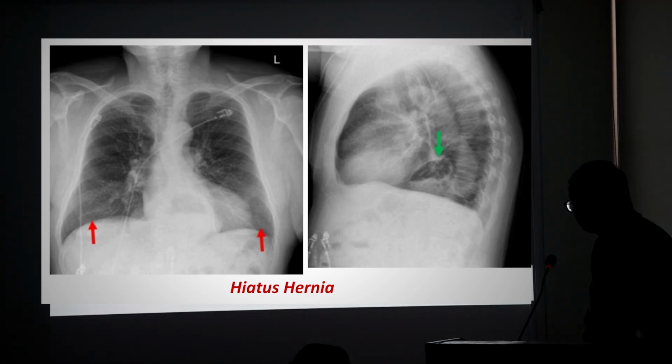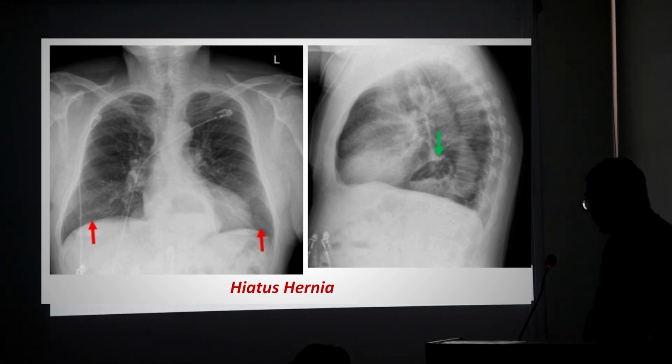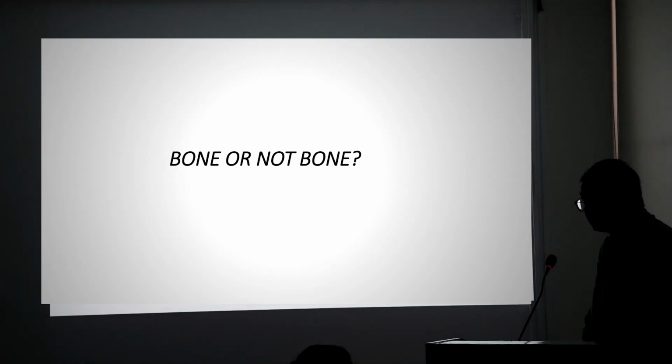So what is going on over here? There's an air fluid level behind the heart. So this is a case of hiatus hernia.